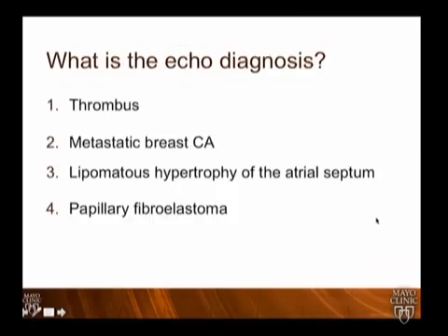So what do you think that is? Is that thrombus? Is it metastatic breast cancer? Is it lipomatous hypertrophy of the atrial septum? Or is it a papillary fibroelastoma? She has breast cancer. She's in atrial fibrillation. What do you think it is?